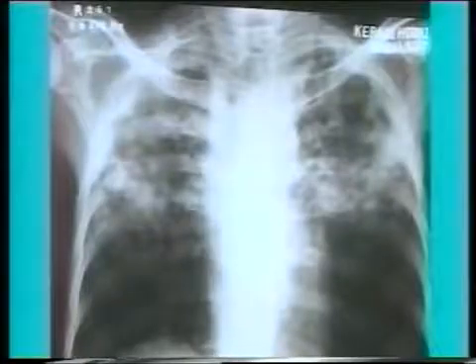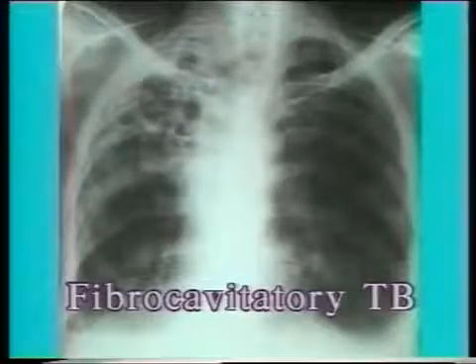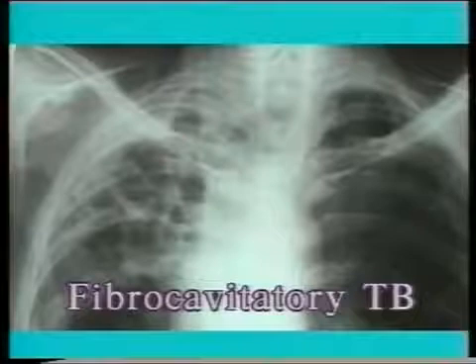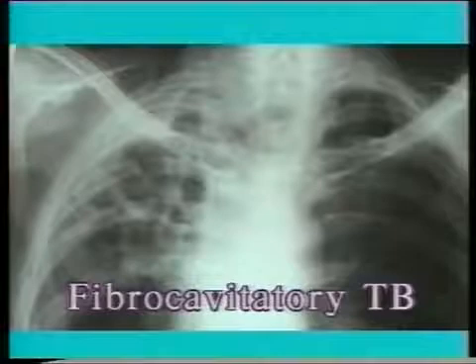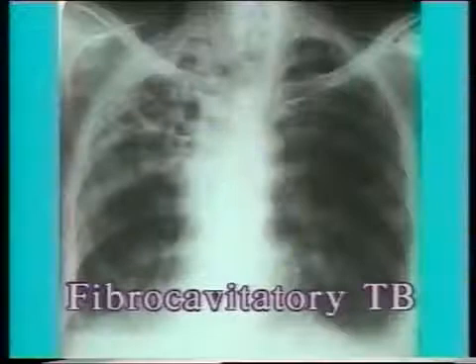This is another X-ray showing bilateral fibrocavitatory lesions. Note the dense shadow of fibrosis on the right side combined with cavitation in the left upper lobe. This is an X-ray of fibrocavitatory lesion on the right side with compensatory emphysema on the left. Note the multiple cavities and fibrosis in the right upper zone with trachea pulled towards the lesion due to fibrosis, while the opposite lung is hypertranslucent due to compensatory emphysema.